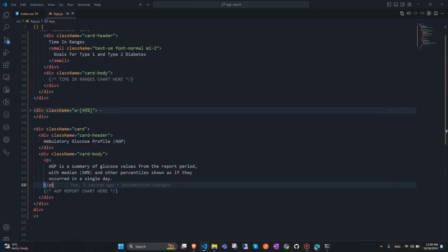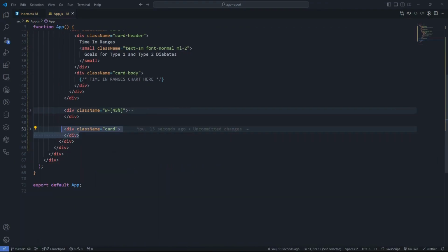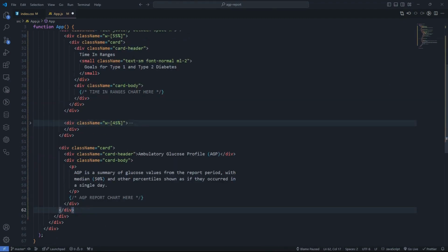So let's take this one, yeah, take out this one here.